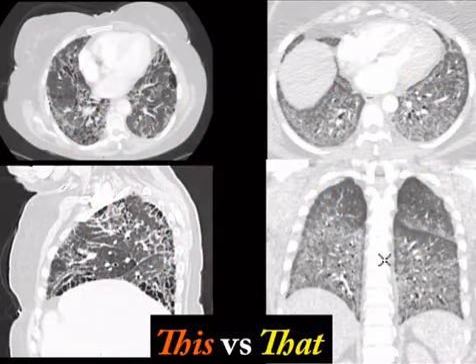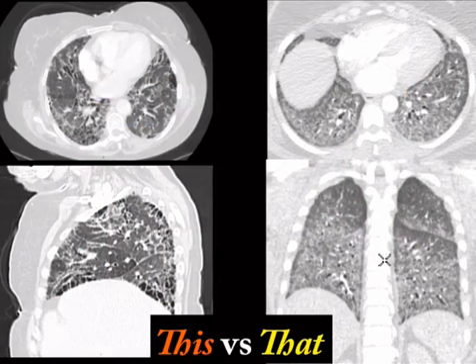All right, let's compare two interstitial lung diseases, and these are the two most common ones. So on the orange case, just a few gamesmanship things with regard to this. If they are showing you either an axial, it's even better, and a sagittal plane, if they're showing you interstitial lung disease in a sagittal plane, they are trying to show you that there either is or is not an apical to basal gradient. In other words, it's getting progressively worse as it goes down.